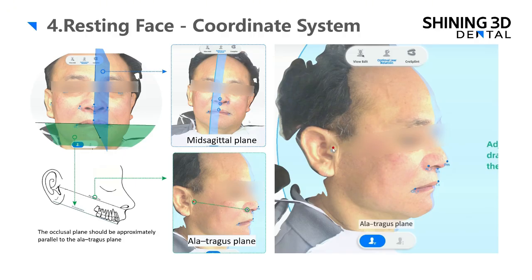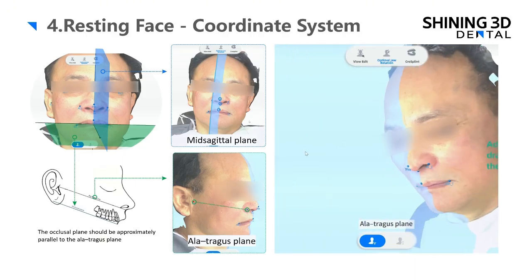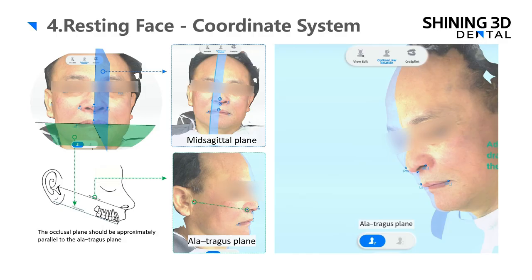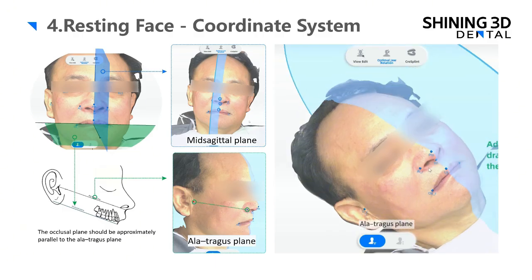The feature points will be pre-selected once we enter this interface, and they can also be manually adjusted. You can select and drag them to a more ideal position for this patient, putting the feature points into the place where they belong.